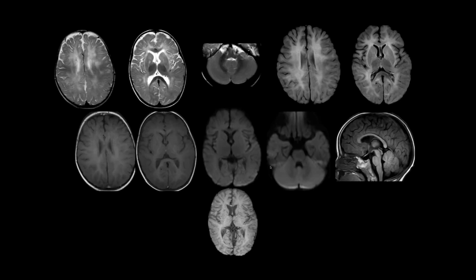Yeah, actually, I discussed, I think, a couple of meetings back. So I think the differentials kept were lysosomal storage disorder, is what I remember. Yeah, okay. So you have these multifocal, more confluent areas of white matter abnormalities, also involving the basal ganglia. Some darkish appearance of the ventral thalami that probably in retrospect could be related to the hyperintense white matter causing these dark changes. But yeah, there is some degree of hypointensity in the ventral thalami. What was the age? 1 year. I think dentate change. Yeah, dentate changes are pretty normal for a 1 year old child.